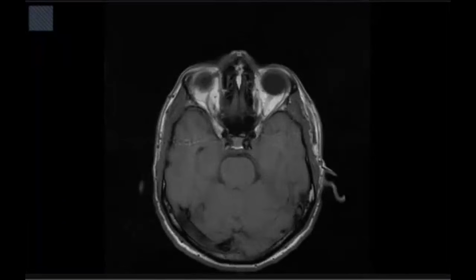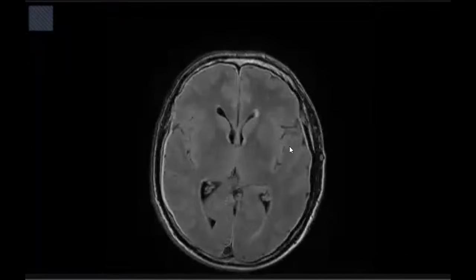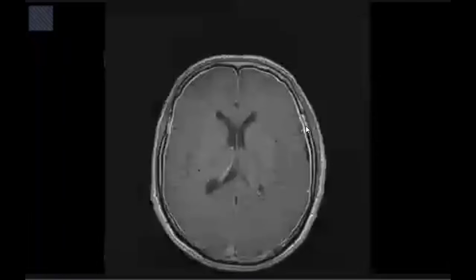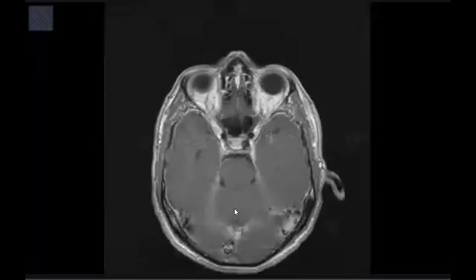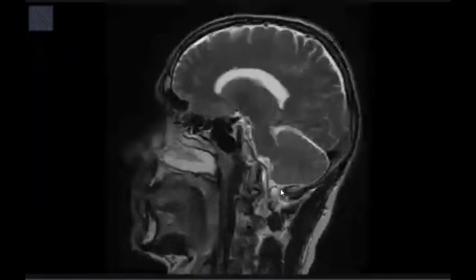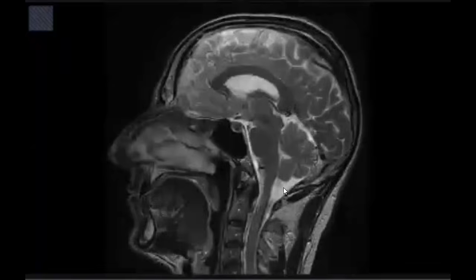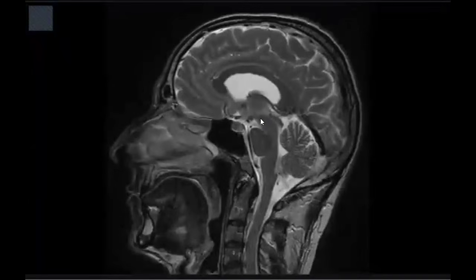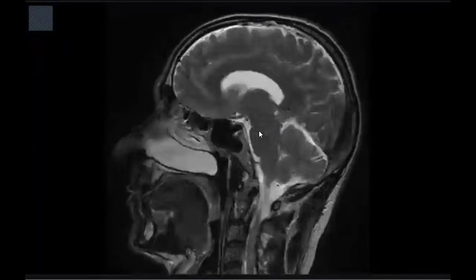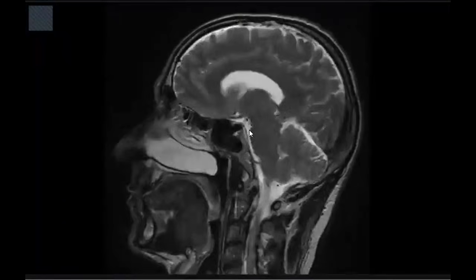You can go for the FLAIR. You can see the dura is thickened, post contrast diffuse smooth meningeal enhancement is seen, and also the sinuses on the lateral or the sagittal view. The other signs, as you told, may be some sagging of the midbrain, but here not so much. Also, the engorged pituitary will be a sign of intracranial hypotension.